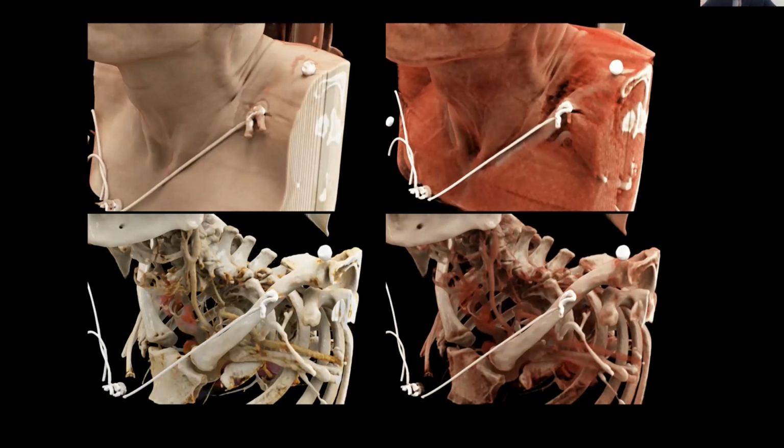So you acquire a volume of data, and if you think about that data in terms of tiny little blocks, we talk about voxels and pixels, right? A voxel is a volume element of tissue. A pixel is a picture element. So the volume element of tissue corresponds to the picture element that you see on the screen, right? Now, each of those individual small blocks that make up this large volume of tissue can be looked at in various ways.